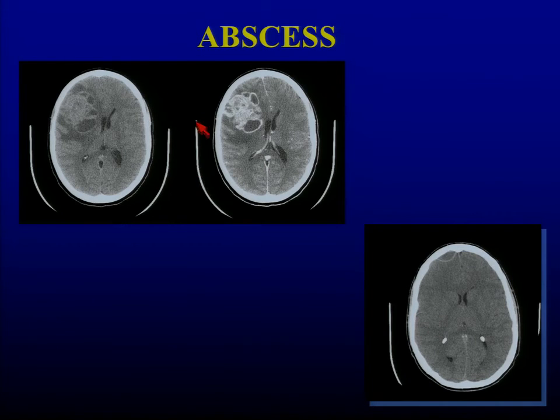Abscess, again, kind of an easy one. This patient's going to be crazy sick. Looking at my brain, I have loss of gray-white differentiation. I have loss of side-to-side symmetry. I have pressure. My right lateral ventricle is compressed over. If I give some contrast, again, if it's an abscess, tumor, or blood, it's going to highlight. So this wound up being abscess. Now this will be the one that's the subtle one. This was a very small abscess that was initially missed.